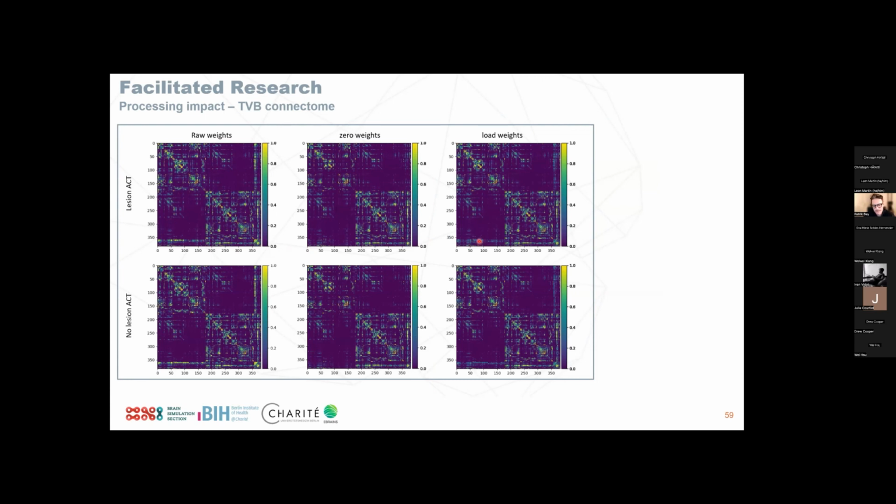Here, we still see these regions present, but they're actually reduced because, for example, this region was 50% encapsulated by the lesion mass. Right? So we see these different embedding methods if we take a close look at the SC, but on a first look, because it is the same patient, they look fairly similar.